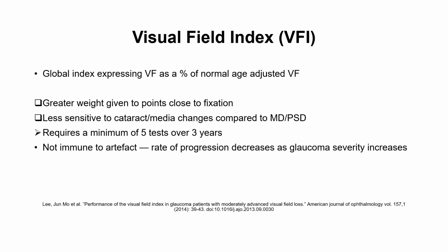So it's a very, very useful marker to follow the progression of glaucoma patients in every stage of glaucoma. However, in the severe advanced cases, you cannot depend only on the visual field index as a marker of progression, but in general, it's a very useful marker of progression.